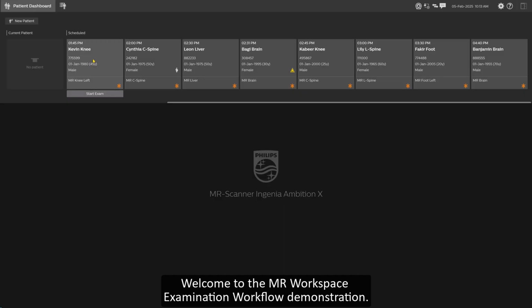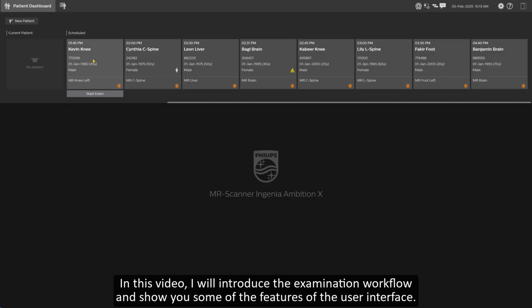Welcome to the MR Workspace Examination Workflow Demonstration. In this video, I will introduce the examination workflow and show you some of the features of the user interface.